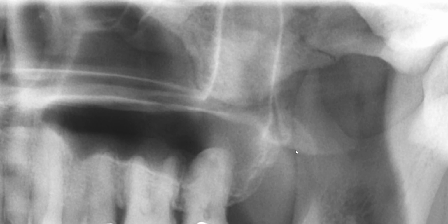But what's interesting to note is this line doesn't just end there. Let's see if I can adjust the contrast once again. It actually is continuous and it goes up in this direction.